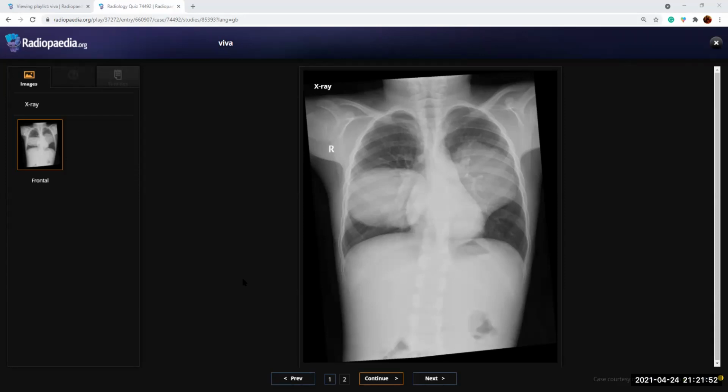So with well-defined margins, it can be. Okay. Looks like a mass lesion, but it's bilateral. You mentioned that you can see the lung, what do you call parenchyma, through it. Yeah, so I can see some lung parenchyma. Yeah. So what does that suggest?